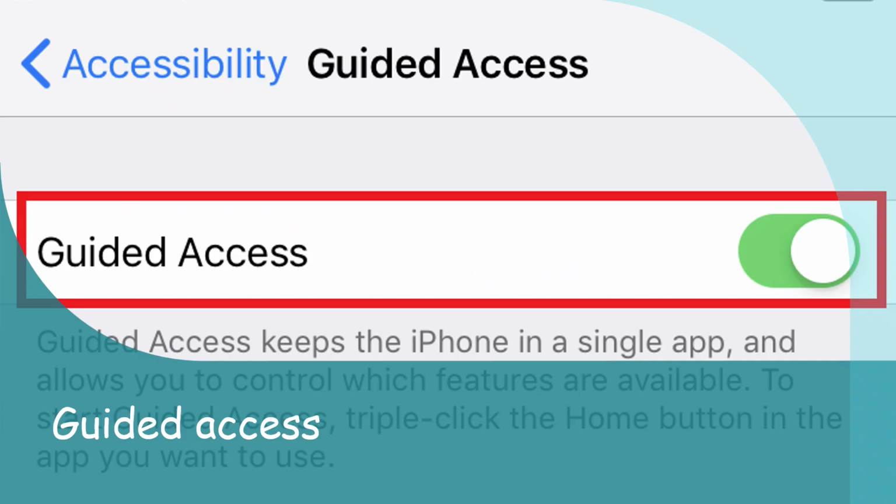So as the iPad is dedicated to communication, we need to set up guided access, which just stops the individual from going onto other apps or searching for things. And there's a short clip on the next slide which will support you in how to set up guided access.